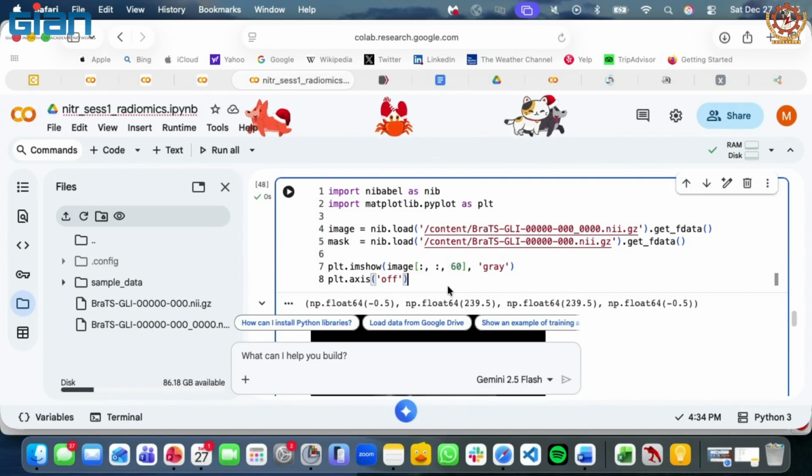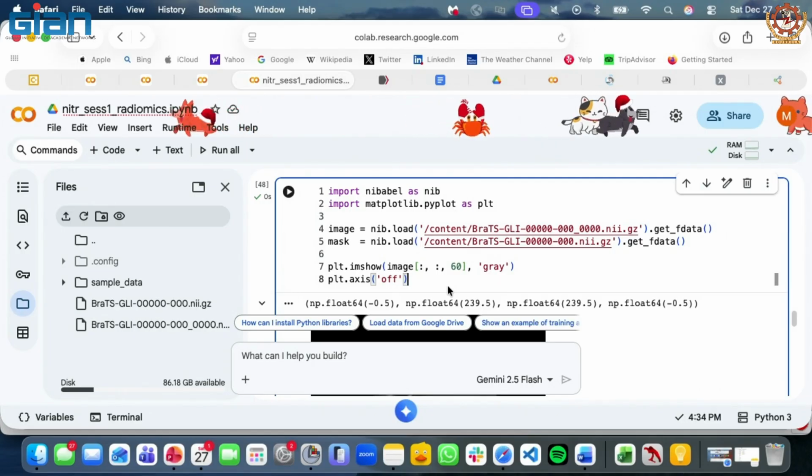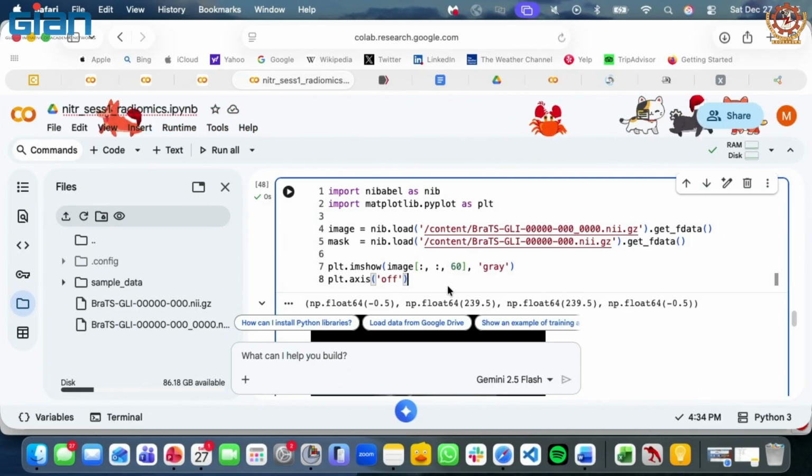So you guys should feel as confident as a coder now, because when there was no Colab, people had to manually code. And if there was one error, you would figure it out after 10 steps. Here, Colab is by default writing the code for you. So if you know the concepts well, coding is not a problem now.